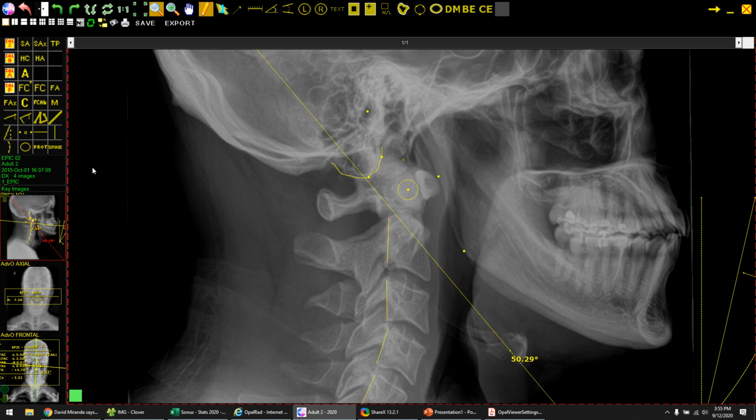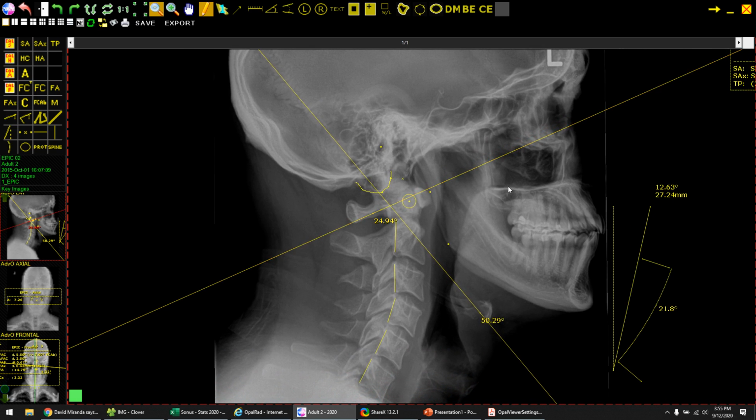To get the frontal perspective, that one's not just straight on, so it's not just a 0-degree X-ray. It's actually going along a plane line of the atlas. So that one, let me change that. So how we describe that is going along the posterior arch, and the X-ray that then is coming from the front is looking down this plane line to be able to see the atlas right here.